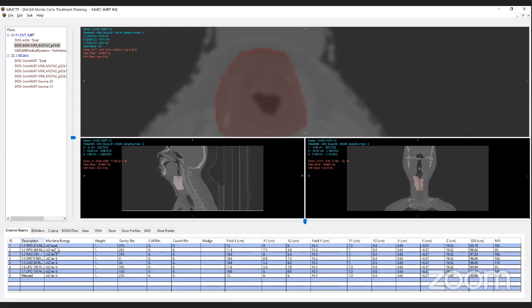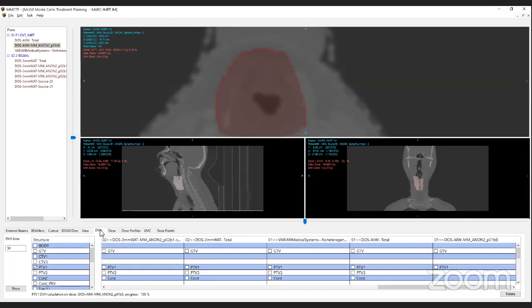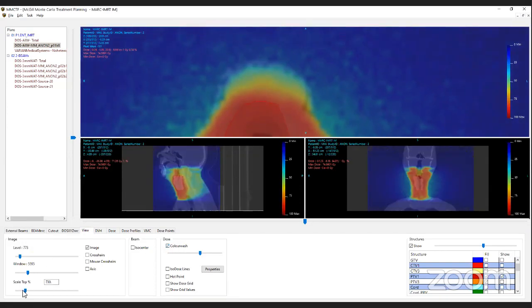This is an IMRT plan, so there are a number of fields, and a number of dose calculations that are pre-calculated. For the purpose of demonstration, I will just focus on this one dose distribution. It's in plan, course 1, beam 8. So this is what I have selected. When I click on the dose, you can see that there is dose there.